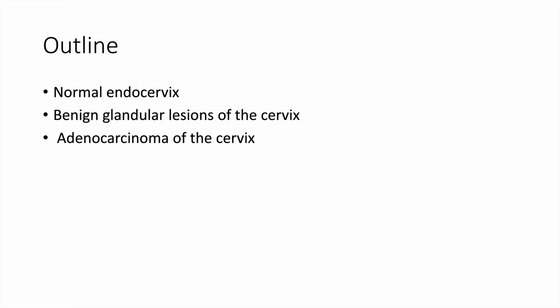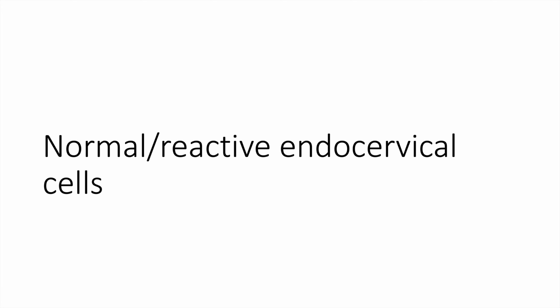Today I will discuss the following. This is the outline, so we'll start with normal endocervix, then move on to benign glandular lesions of the cervix, and then adenocarcinoma of the uterine cervix. So we'll start first with normal and reactive endocervical cells.